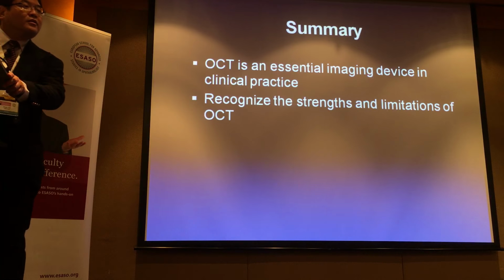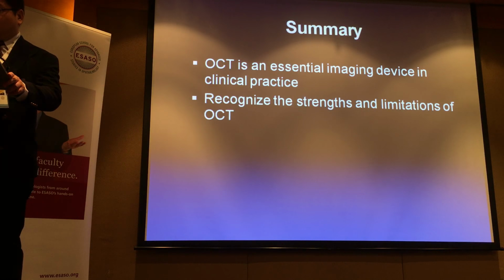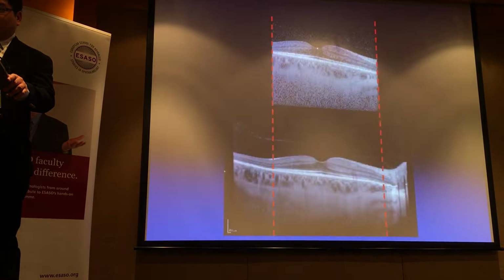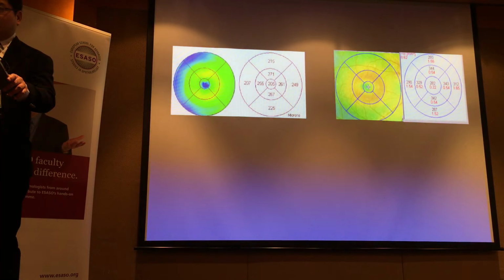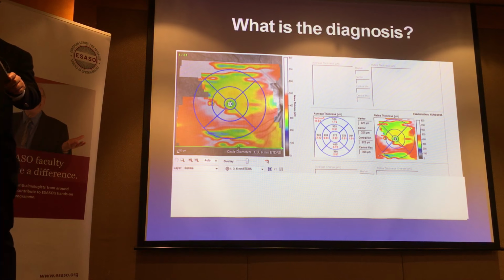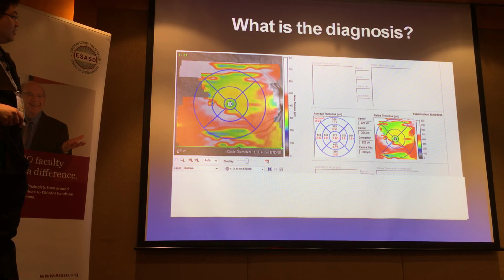Just had a doubt actually. The image that you showed in which there was no pattern, and later it turned out to be a myopic patient. When you go back to that image, this one. Yeah, this one. The point is, this is not showing any particular pattern, so it doesn't fit. Yes. But when we go to the thickness map, now the thickness map is looking normal here. Which part of it? The average thickness, this one.